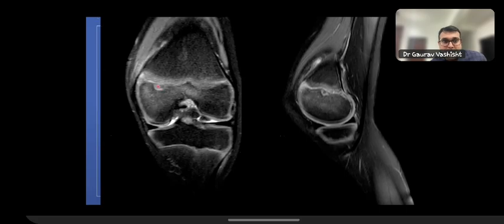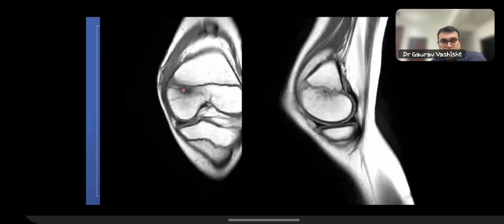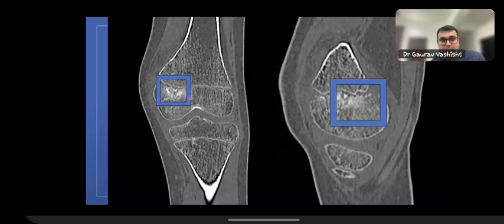So there was a small nidus sitting here along the growth plate. Okay, this dark area here surrounded by bright signal. This was a periphyseal osteoid which was creating a lot of inflammation around this, causing growth plate irregularity, edema in the surrounding tissue. Okay, and despite that, the orthopedician wasn't agreeing that this is an osteoid and we finally got a CT cut for this, and we showed him the nidus, that this is an osteoid.